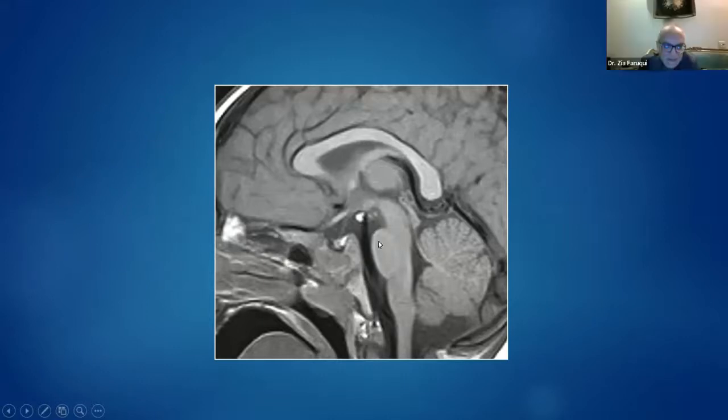So obviously the pons, and in front of it there is a flow void, which is a black structure. Here there will be either flowing blood or air. So air cannot be here, so this is a vascular structure. So this is the basilar artery, and you've got a little thrombosed aneurysm at the tip.